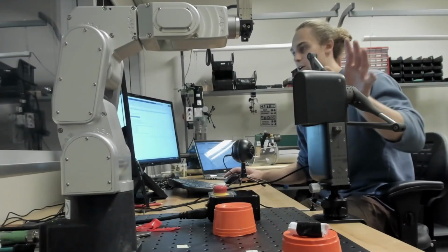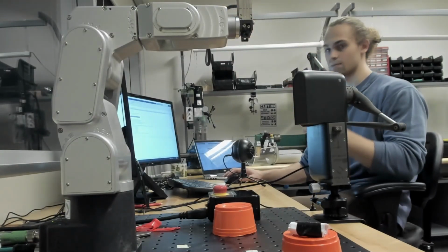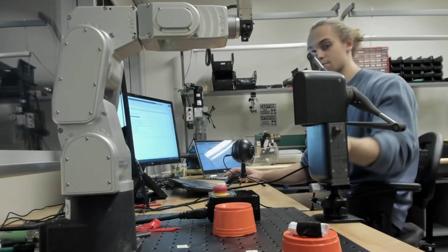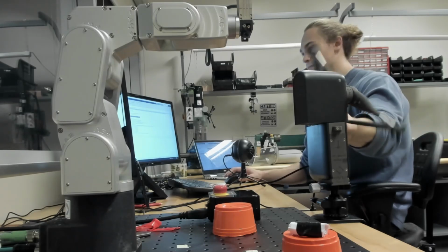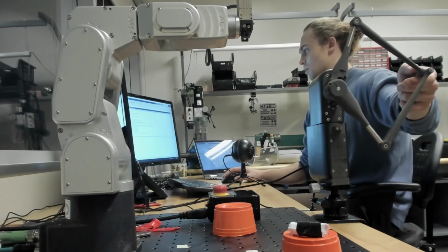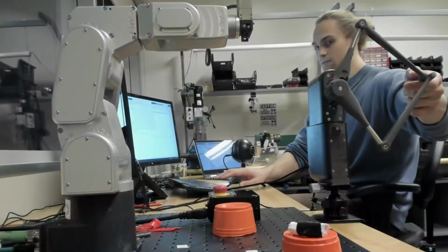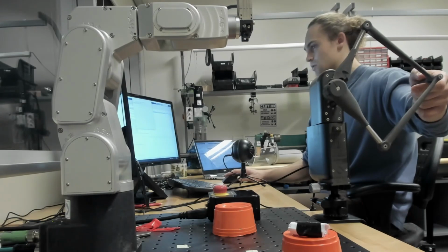You'll notice that I've got the gripper on the robot already. That's for the next activity, so it's not important for this one. You might not even want to put it on the robot until you've done that, but it doesn't make a difference. So I'll home the haptic device, and I'll run the script and we'll see what happens. So at this point, this GUI's popped up, and you can start by pressing the spacebar. Or clicking on it, I guess.